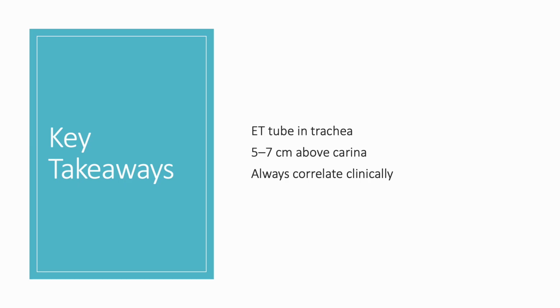So to summarize, always confirm that the tube is within the trachea, positioned about 5 to 7 centimeters above the carina. Assess anatomy carefully, consider neck position, and always correlate radiographic findings with the clinical picture.